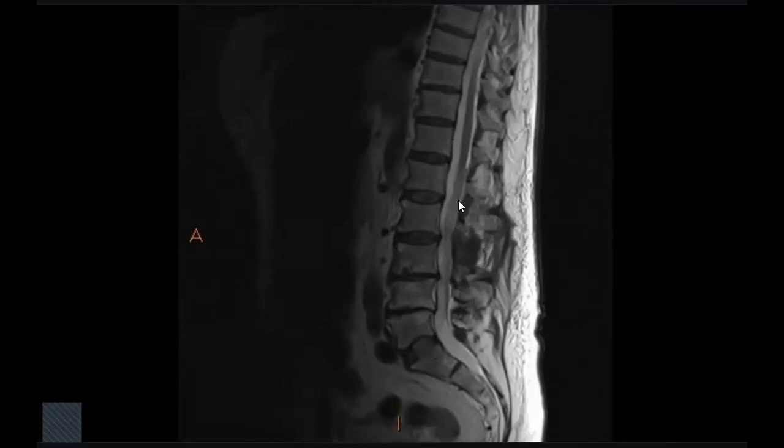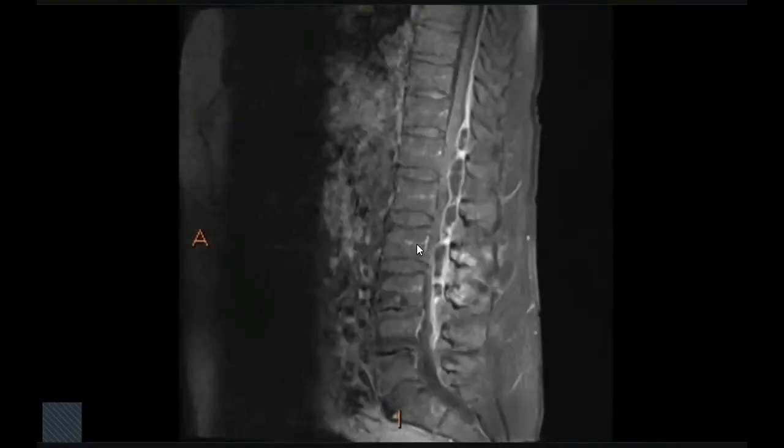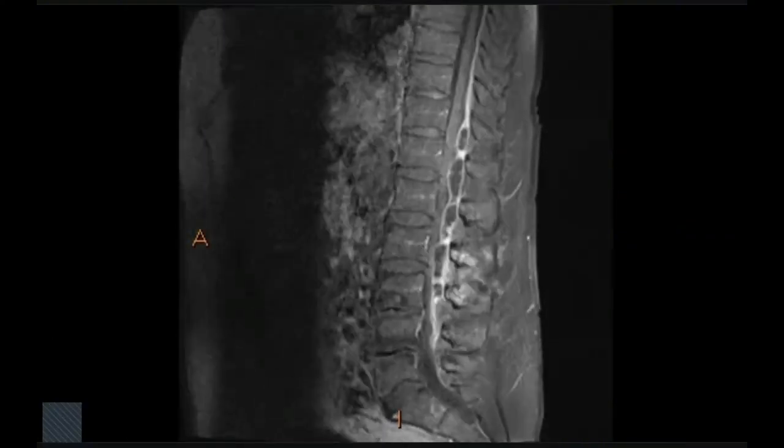In my opinion, you go for arachnoiditis, but the main pathology is epidural. I don't know why. I think the epidural collection is evident. Why are you going for arachnoiditis here? You didn't convince me there is arachnoiditis really.